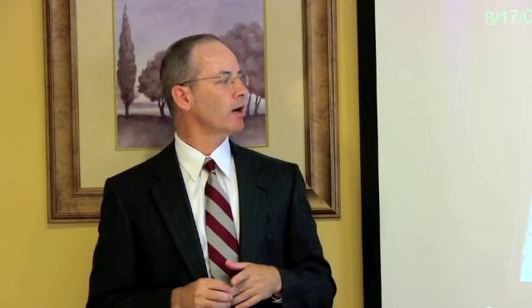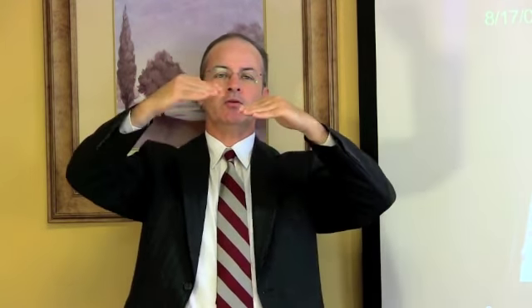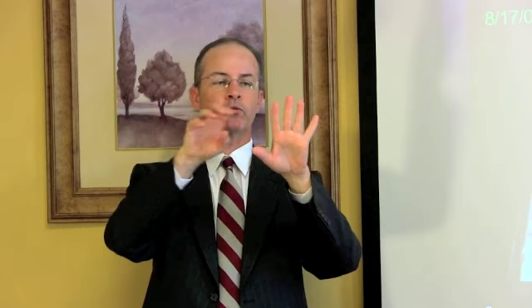This is another way we looked at progressive atrophy in a patient. This is a different patient. What we did here was we took the day of accident CT scan and compared it to a later MRI scan. Again, as I mentioned earlier, you have to be careful comparing CT to MRI. You have to be careful to get the slice angles lined up correctly. But we did that in this case and then used the morph movie technique to morph one into the other.